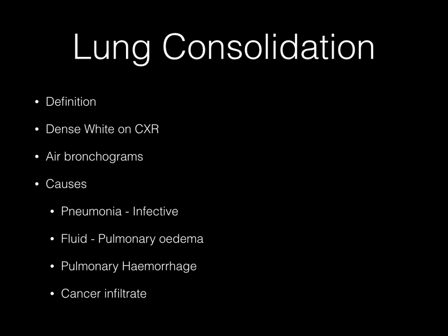Now, let's talk about lung consolidation. If the alveoli and small airways fill with dense material, the lung is said to be consolidated. It's important to be aware that consolidation does not always mean that there is infection. The small airways may fill with material other than pus, as in pneumonia, such as fluid, like in pulmonary edema, blood, or even chemicals such as fluid from the gastrointestinal tract, like an aspiration, or even cells such as cancer. They all look very similar, and the clinical information will often help to guide the diagnosis.